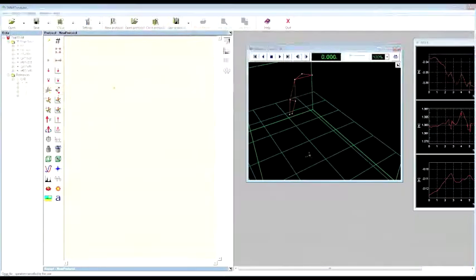So, in order to understand which blocks of operation I have to consider, I need to know the dimension of the variable I'm going to compute. So first of all, I need to know if it is a 3D or 1D variable, and which will be its physical meaning or its measure unit.